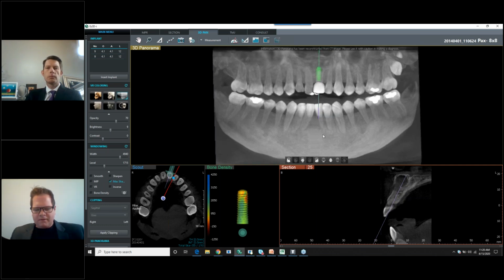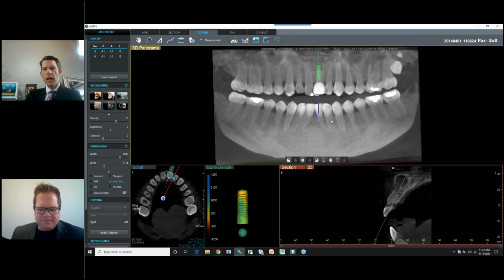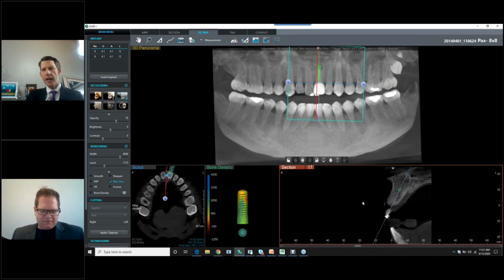Okay, so anything you want to add, Jim? Yeah, let's talk about one more thing over here. Another quick way to place an implant. Right, let's go over here to number 8 really quick.